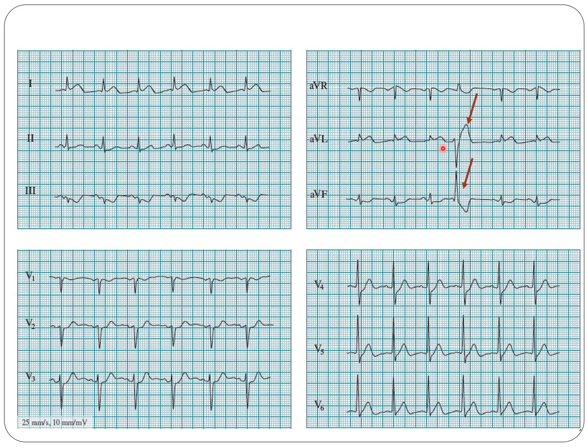Pathological condition, here we do have a premature ventricular beat, and additionally we do have ST elevation in lead number 1 and in AVL, but nothing else. A little bit ascending ST depression can be seen in V4 and V5, and if you look at the QT interval, it is a little bit shorter, so that can be the sign of hypercalcemia. In the limb leads as well, so I would go for the hypercalcemia as well. And of course the high lateral hyperacute MI. This dome-shaped ST elevation is very characteristic of a hyperacute MI.